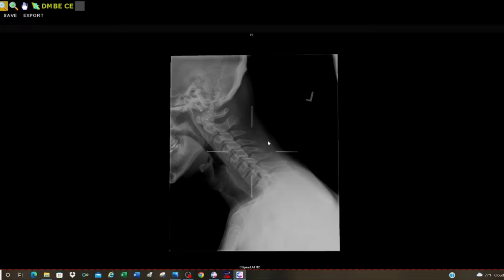In this patient, they are having numbness and tingling, weakness into their fingers, their hands on both sides. This patient needs to use their hands for their job, so that's why they came to me. And the nerves that exit out of the mid-neck are directly what relate to the hands. And so that was another key point, was that we knew exactly what symptom they were dealing with. So we knew where to kind of cheat and look at the area of the spine, but very clear cut, C5 not moving off of C6 whatsoever. We'll talk about in future videos how you fix that.